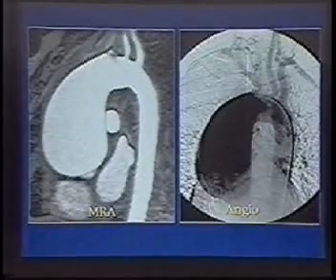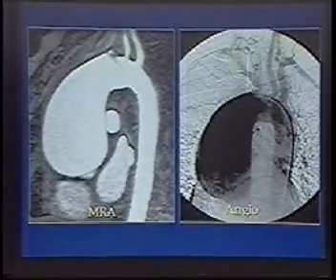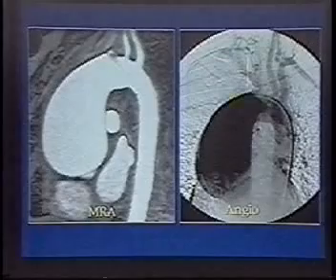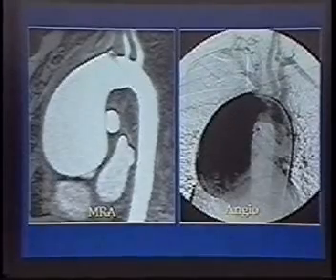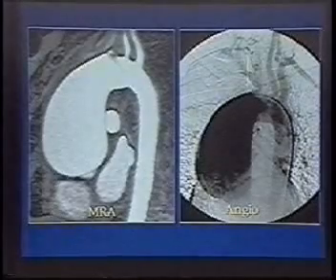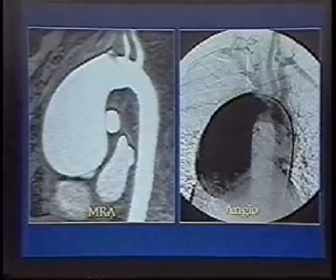And this person did have Marfan syndrome. So this is a characteristic appearance, the tulip or bulb shape of the aorta. And these get very large. There are three risks of annuloaortic ectasia. The least significant or least important one is aortic insufficiency. The valve becomes dilated. So there's aortic insufficiency. And the worst ones, the life-threatening ones, are dissection and rupture. So rupture, most patients will die immediately.